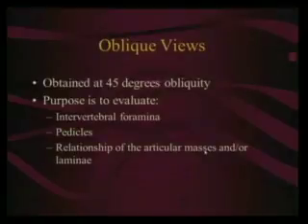These are my favorite. I love oblique views. I'll wear y'all out on oblique views. If you're going to get a plain film study of a C-spine, for God's sake, get the oblique views with it. Otherwise, it's totally worthless. These are obtained at 45 degrees of obliquity, and the purpose is to evaluate the intervertebral foramen, the pedicles, and the relationship of the articular masses and/or the lamina.